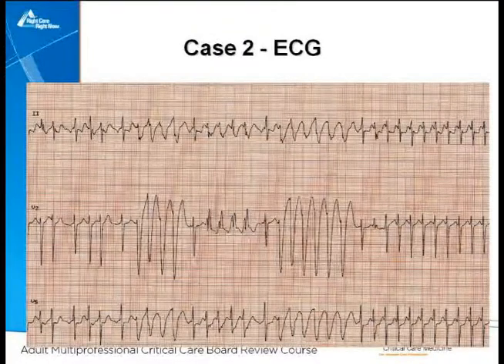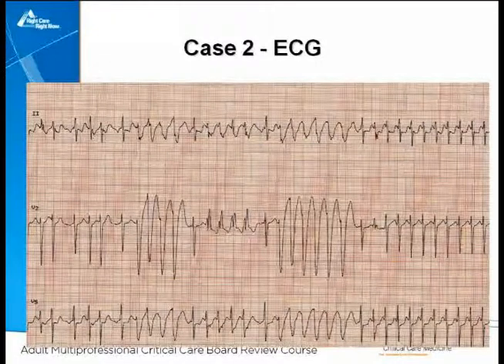And propafenone is a drug for which this is its major toxicity. It can take atrial fibrillation and convert it to atrial flutter, and it delays conduction in the His-Purkinje system. So alternating bundle branch block, which is what this is. This is both right and left bundle branch block occurring alternately before it goes to one-to-one conduction. So this is the classic atrial proarrhythmia seen with propafenone.